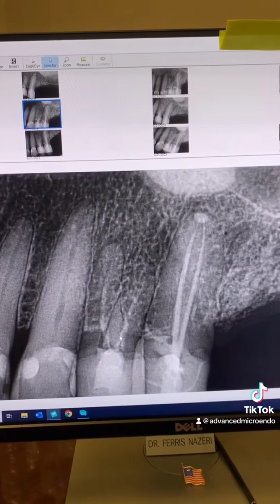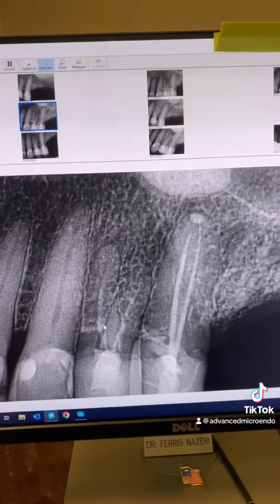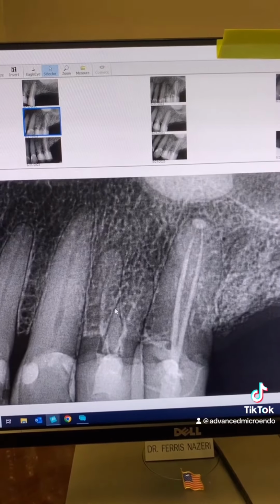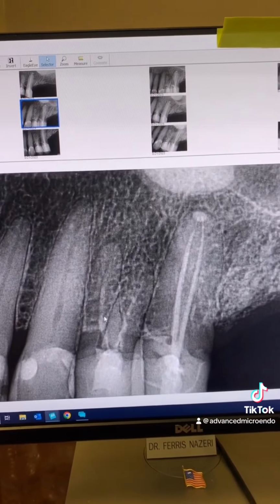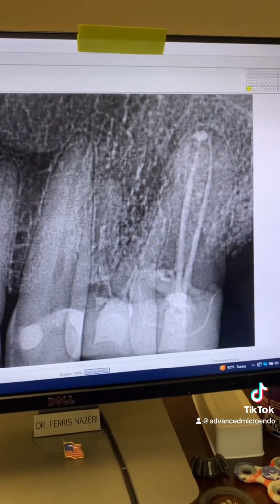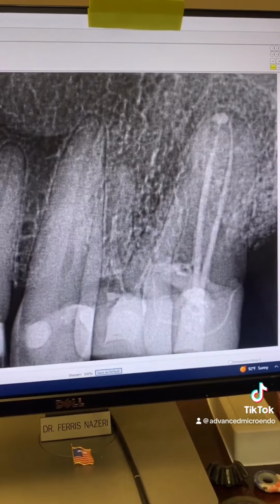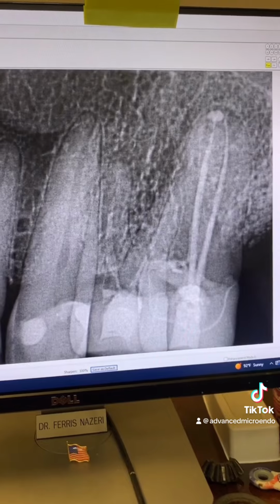Remember when I was telling you pretty white lines on an x-ray don't mean anything? Well, now you see why. The obturation is horrible, but perhaps the dentist did a good job with instrumentation, cleaning, and shaping of the canals. The obturation is lousy, so what? For some of you, obturation is the ultimate goal. You just want to create pretty white lines on an x-ray. That's your goal. So you take shortcuts, or you don't adhere to the fundamentals of endodontics.